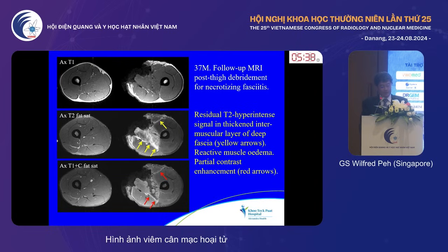So this is necrotizing fasciitis, again occurring in the previously operated patient, with typical thickened T2 signal and some enhancement.